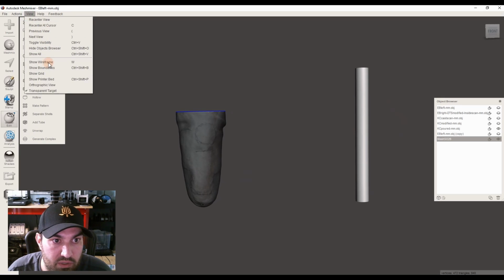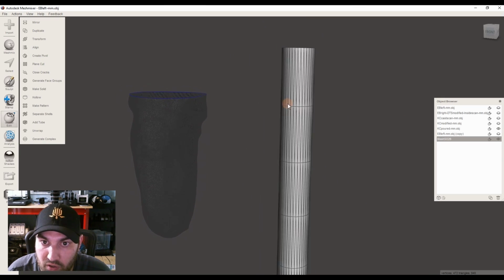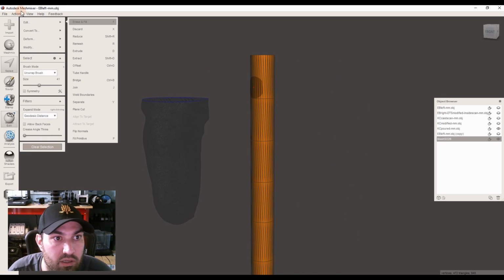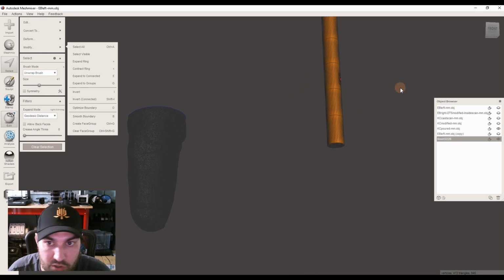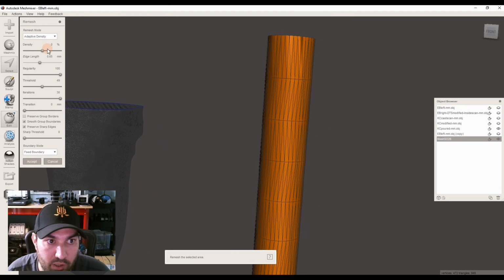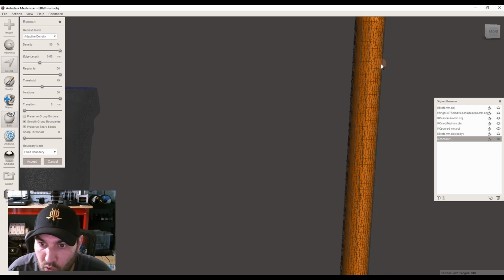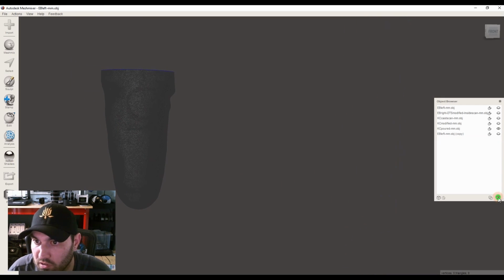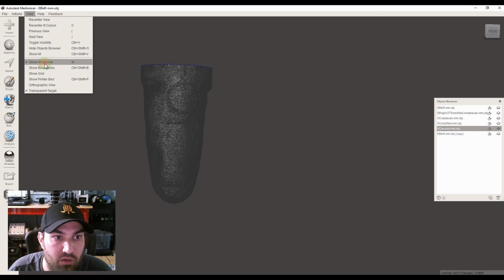And then this is where I was saying the wireframe is going to be a little weird and hard to work with sometimes. So sometimes you might have to remesh some of these shapes, and usually because they're so nice and clean, you can just do the Control-Alt, edit, remesh, and that's not going to bog your computer down too much. Turn that density up and just give yourself more facets to work with on something like that. So we'll delete that. Let's turn off our wireframe.